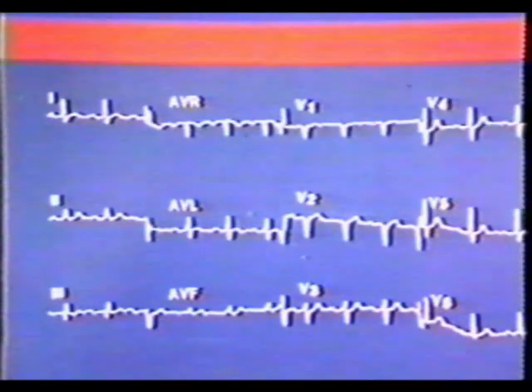This is the ECG from a 67-year-old male who presented to the emergency room with several hours of severe chest discomfort. He had never had any prior episodes of chest discomfort. The tracing shows first-degree AV block and low anterior forces, but does not show any impressive repolarization changes.